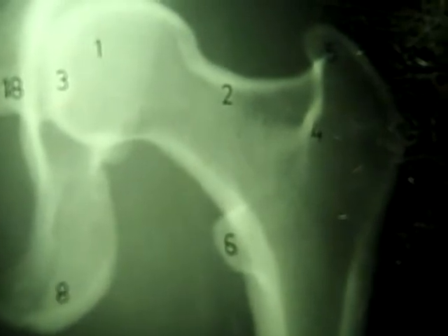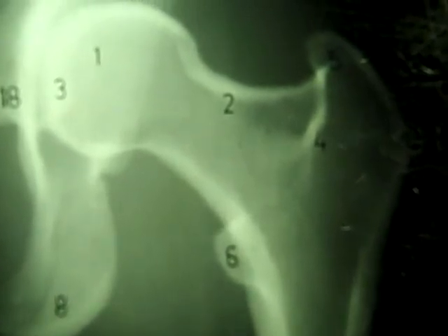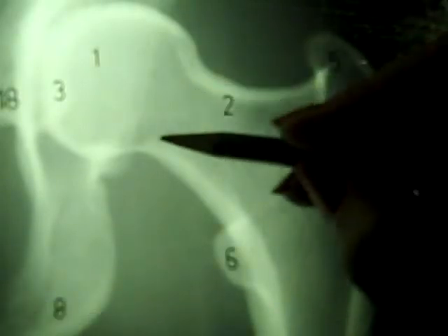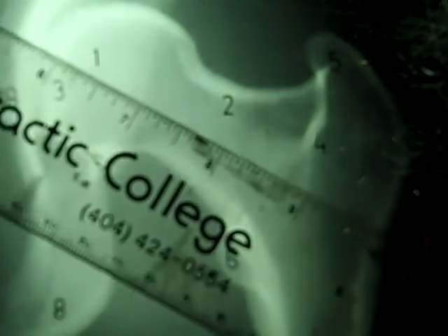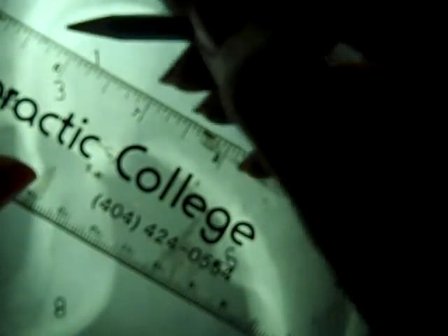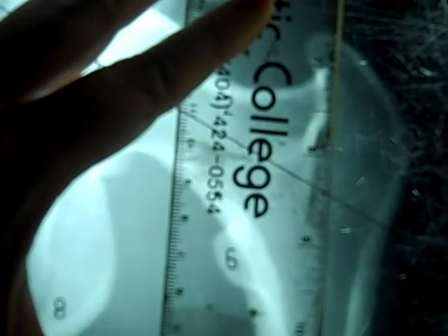So now I am using this film to do femoral angle, and for femoral angle I am going to draw a line that represents the mid-axis of the femoral neck. Now the femoral neck is this portion right here, and so the mid-axis is a line that represents the angle or the slope of that femoral neck, and that looks pretty good to me right there. So I will draw a line right there, and then the second line is through the mid-axis of the shaft portion of the femur, and so I'm going to line that up like that.